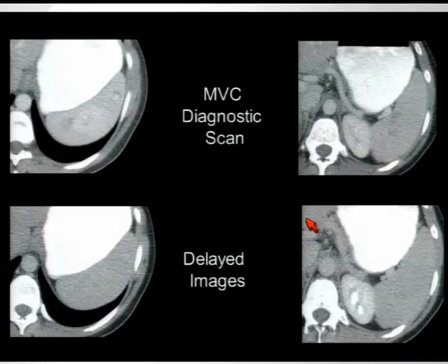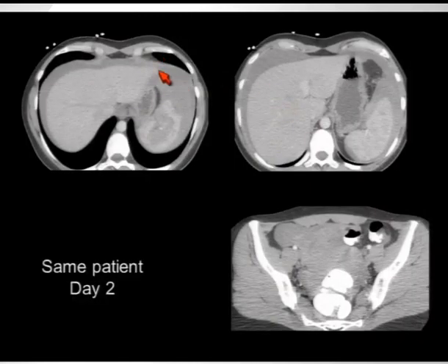And the reason why these unidentified splenic objects are important is here's a very old slide, and you can see here there's an area of abnormality, a hyperattenuating focus in the spleen. You can see on the delayed imaging it's not changed, so clearly this is a pseudoaneurysm within the spleen. There's no evidence of active extravasation, so this was not considered for embolization, this was not considered for surgery at the time. The following day, the patient's blood pressure crashed, and you can see here we've got what we used to call delayed rupture of the spleen.